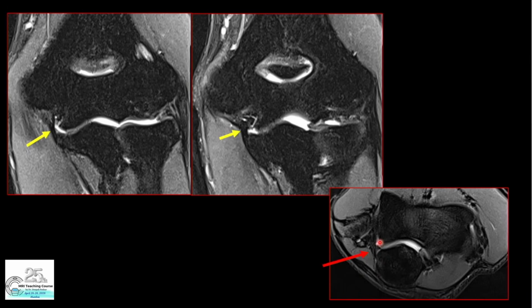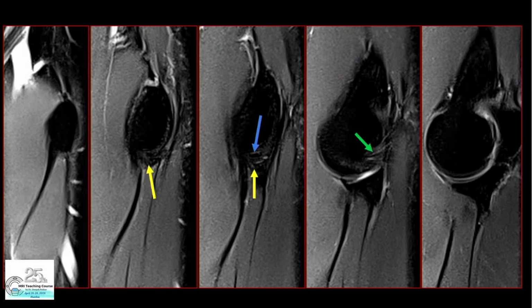Once you've gotten used to it and you're trained in doing that, then you will be able to identify all the pathologies much better. But these are just to begin with guidelines. The anterior bundle of the UCL is best seen on your coronal images. The posterior bundle is best seen on your axial images. But as I will show you, you will see them on all 3 planes.